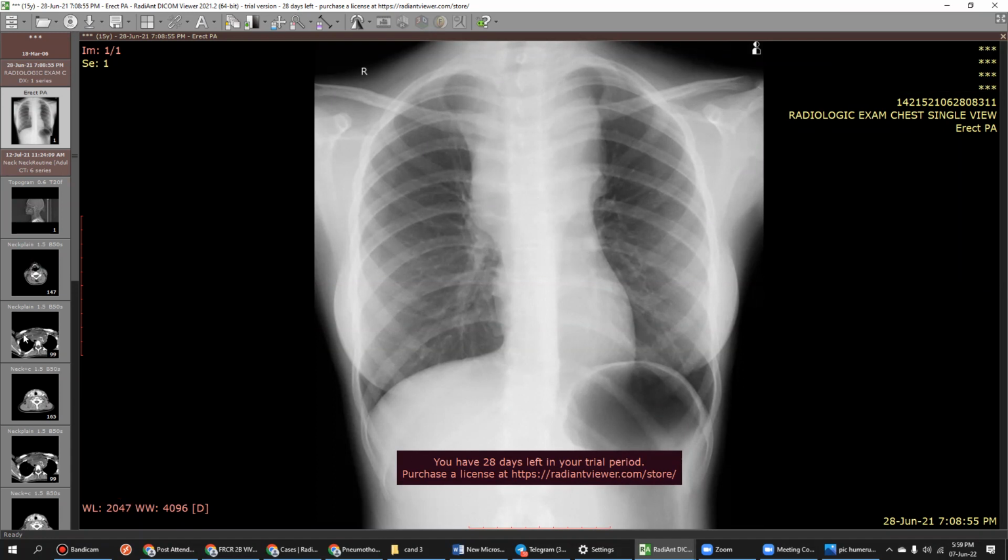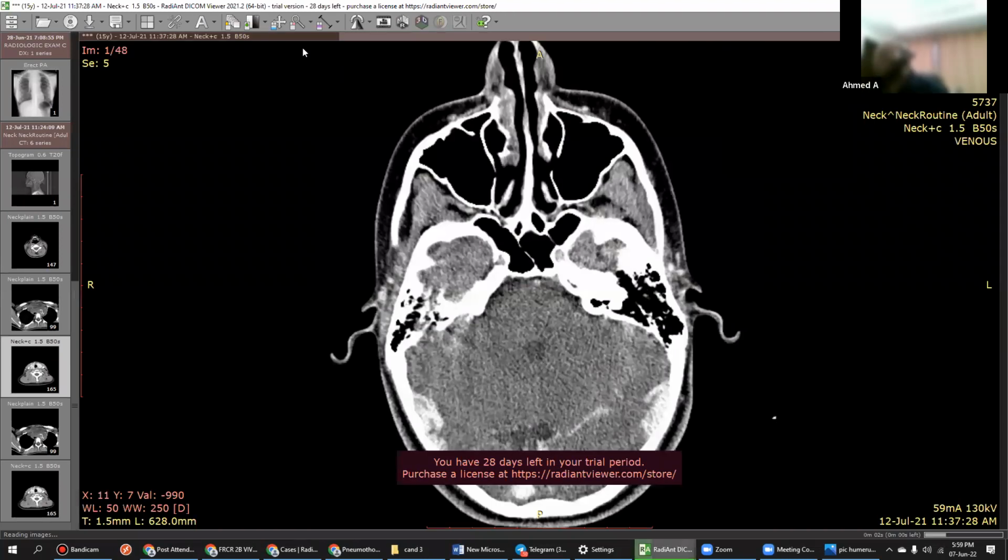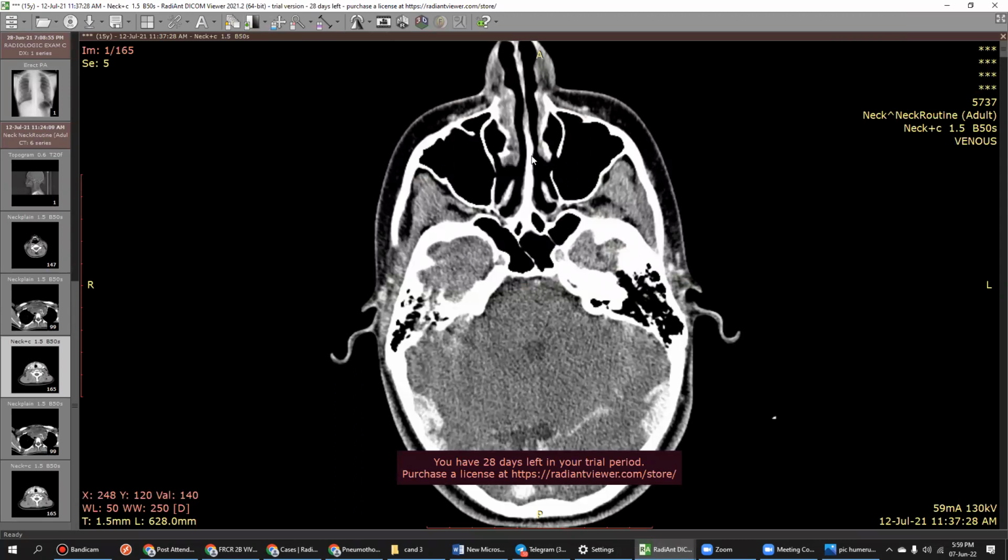Right. Okay, so because first you are telling anterior, that's why you should not come into the anterior only. You have to tell superior. Understood, right? Okay, scroll through.